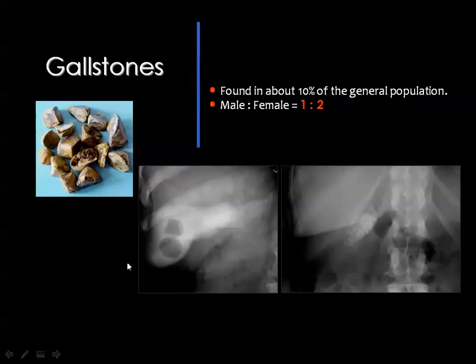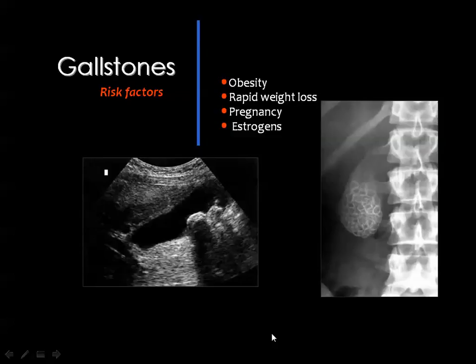And this is an oral cholecystogram showing the gallbladder distended by the contrast media with two radiolucent calculi seen as filling defects inside the gallbladder. And this is a plain film of the hypochondrial area showing too many small radiopaque stones in the region of the gallbladder. And here you can see the typical appearance of the gallbladder stones by ultrasound. Gallbladder stones are mobile, and they produce this very characteristic posterior acoustic shadowing during ultrasound exam.